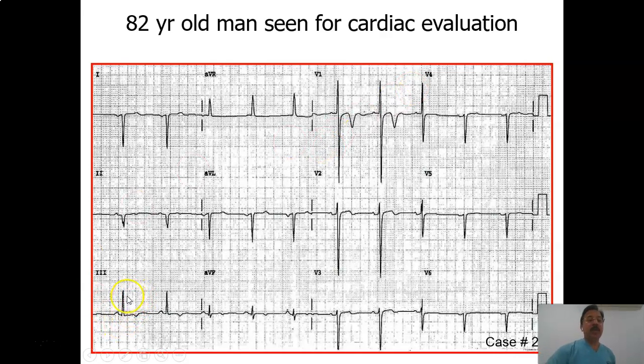The rate looks like a slow ECG, bradycardia, but there is a P wave followed by the QRS complex. So it looks like the rhythm is coming from the sinus node. Axis: there is right axis deviation. Hypertrophy is difficult to comment on, but if we see the criteria for right ventricular hypertrophy, it looks like right ventricular hypertrophy.